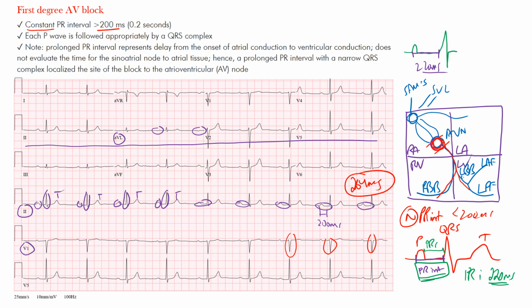All right. So again, minor AV conduction defect, partial block at or below the AV node. P waves always precede the QRS complex, but with a fixed prolonged PR interval. You always have atrial activation transmitted to the ventricles, but a constant delay in that. All right. Clinically, it does not tend to cause any hemodynamic instability, and there's no specific treatment required for this.